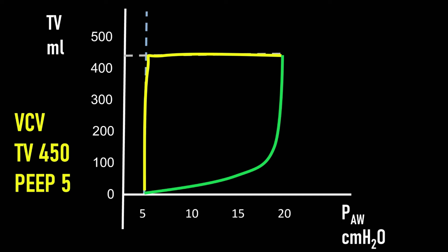I'm going to overlay the normal volume pressure curve for this particular patient. There is much higher pressure required in inspiration and much higher volume in expiration. This is an example of airflow resistance in both inspiration and expiration. And there's lots of reasons why this may happen, and I will cover this in the next tutorial. But when you see both inspiratory and expiratory resistance, you have to think of things like foreign bodies in the airway, or a kinked endotracheal tube, or a plug in the airway.